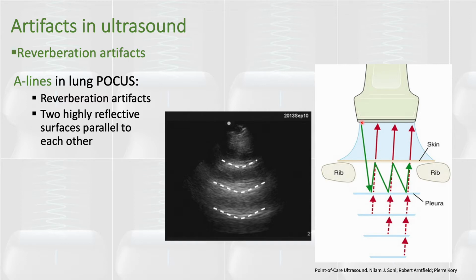But some of the ultrasound beams are not going to be reflected, and they will penetrate the pleural surface, and then they might be scattered back by the air. And we know that air is generally considered to be the enemy of ultrasound because it tends to scatter the beams all over the place. So this reverberation will lead to formation of what looks like another pleural line.